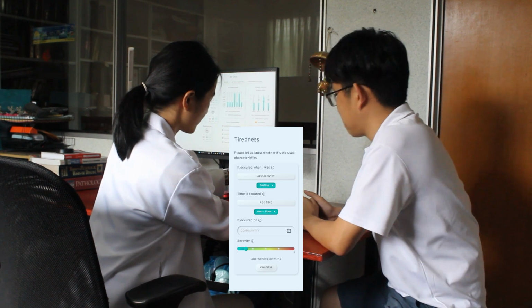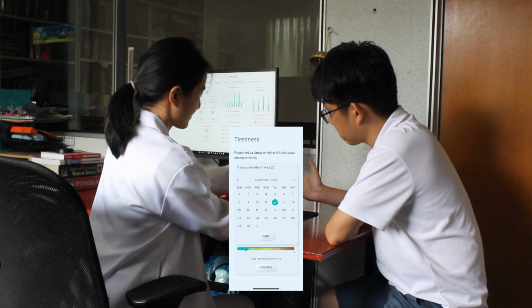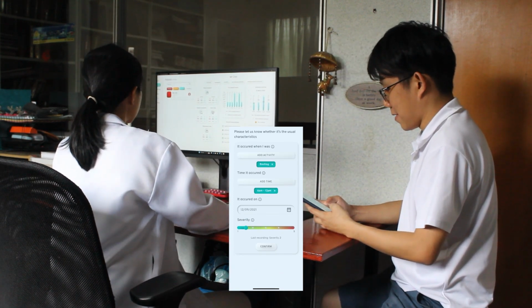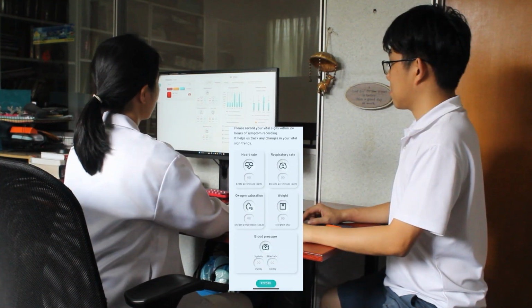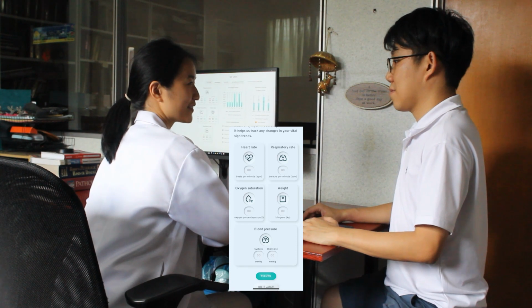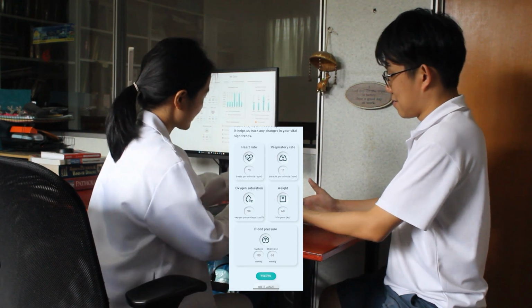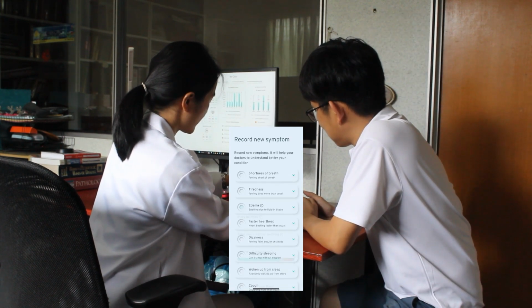Whenever a patient verifies it is true, the context-aware intelligent agent will recall from the previous setting the characteristics of the heart failure symptoms to ask if it remains the same or if any changes, patients can edit. It will also ask specific heart failure symptoms characteristics for the patient to record in real time. It assists patients in knowing what symptoms are relevant and how to place changes in context of objective data.